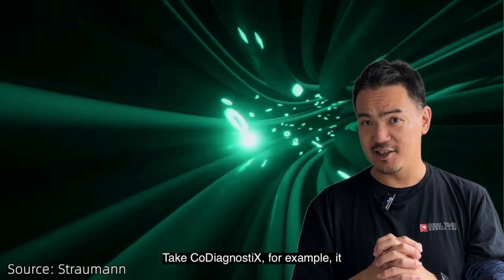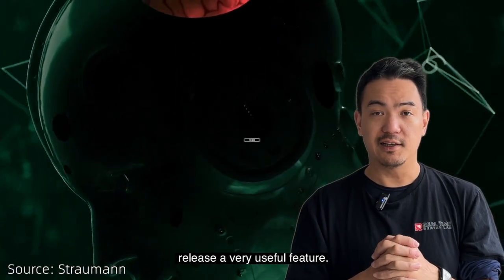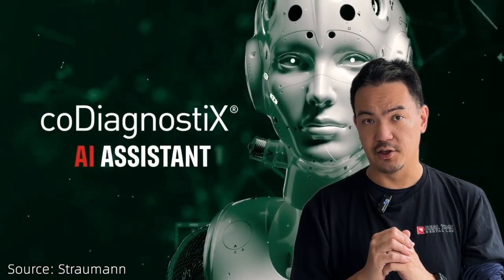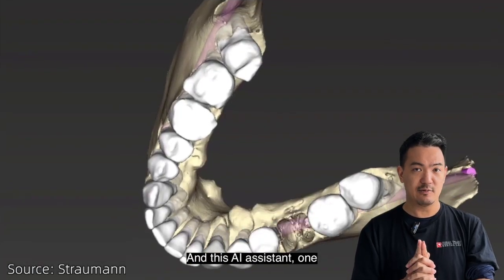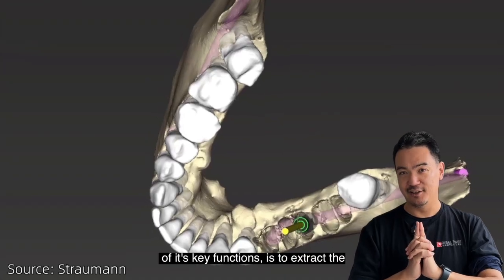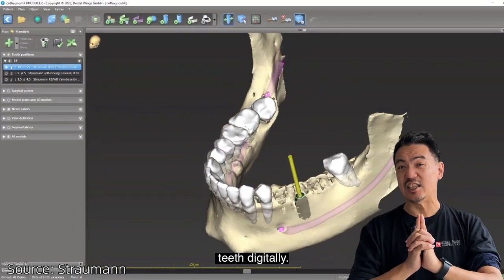Take CoDiagnostiX, for example. It released a very useful feature called AI Assistant, and one of its key functions is to extract the teeth digitally.